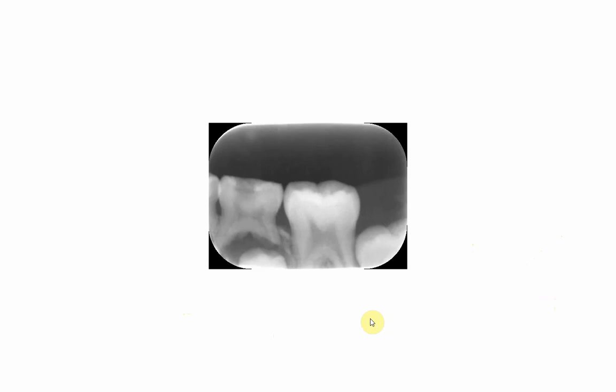Another radiograph for a lower jaw for a pedo patient. See the distance here from the margin of the occlusal surface of teeth and the margin of the film. Especially in the lower teeth, I want you to go back again to the video in which we demonstrated the lower premolars and lower molars, and there was a way to avoid this, to guarantee that the film is pushed all the way down to the floor of the mouth, so that we guarantee that only 2 millimeters are extending off the film above the occlusal plane, and this is the only way where we can get the apices of the teeth.